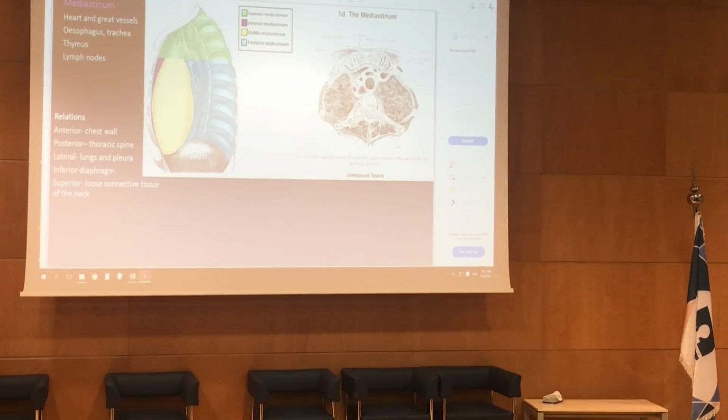So this is a thymus, and sometimes thymus would form tumors, be it malignant or benign. So when I see on the X-ray that it's an anterior mediastinal mass, I already almost suspect the diagnosis, and I know how to direct the patient for more investigation.